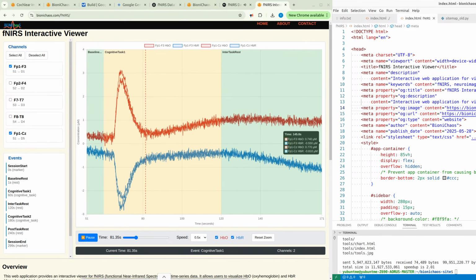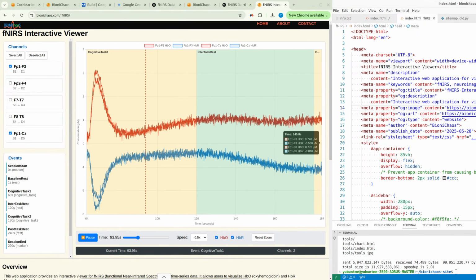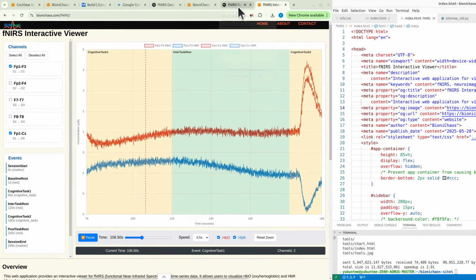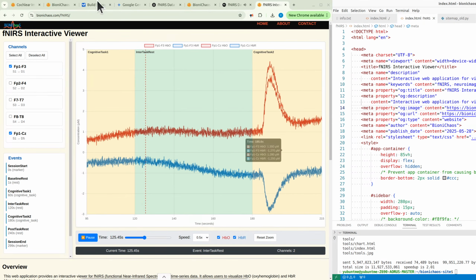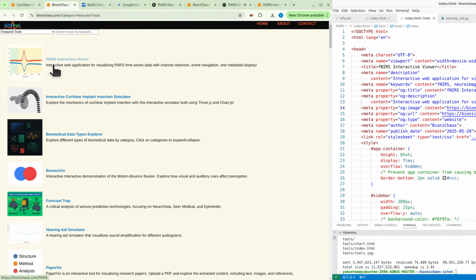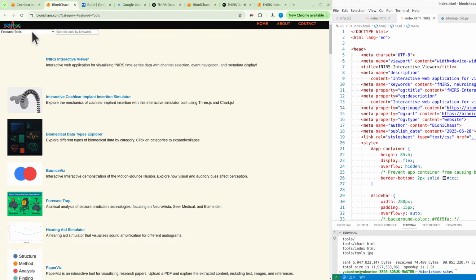That is exactly the question the critique digs into. And yeah, at first glance, it does look like the ideal. You've got these sharp, symmetrical HbO peaks mirrored by HbR dips right when the tasks happen. It matches that expected neurovascular coupling picture. There's always a but. But if you're looking at this expecting it to be genuine, like raw or even lightly processed fNIRS data from a real experiment, there are some pretty big red flags, according to the critique. Okay, like what? What's the first thing that jumps out as maybe off?